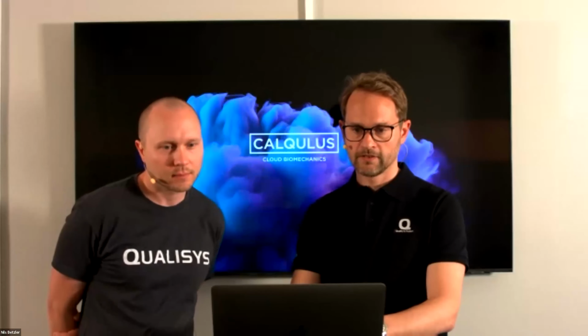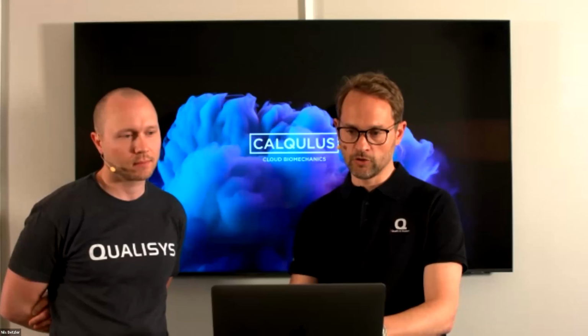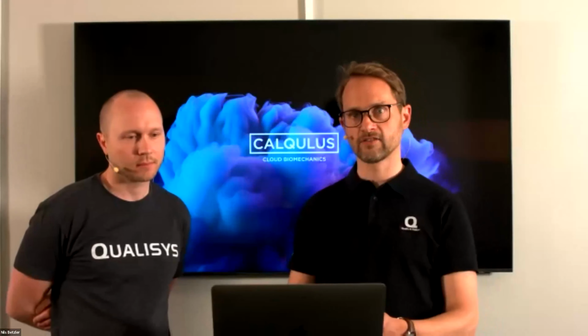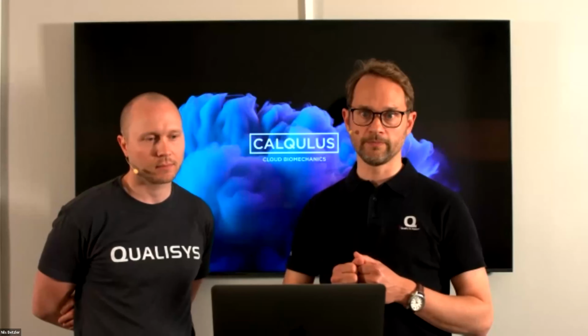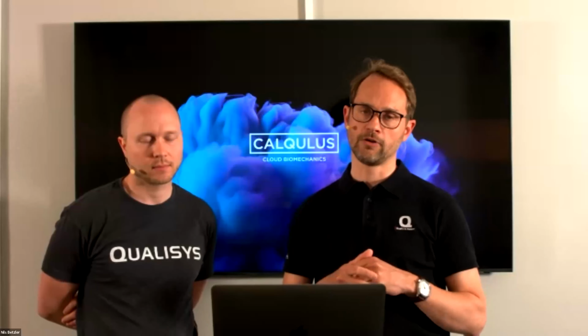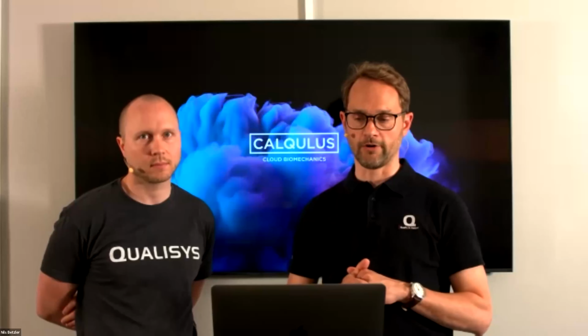Okay, so what happens when I reach the limit of the number of reports for my subscription? Very relevant question. So what happens is we are blocking new uploads. You keep full access to all reports that you already uploaded, and until you either increase the subscription or you delete some reports, you will not be able to upload new reports. You will see a warning in the report center before, and now if you scroll all the way down in the report center, you can also see how much of the quota you're currently using.